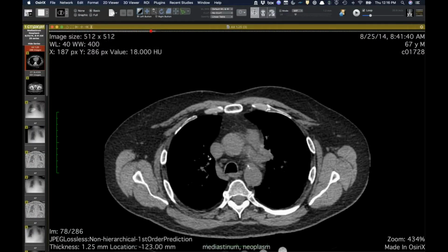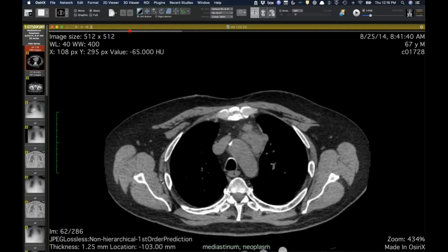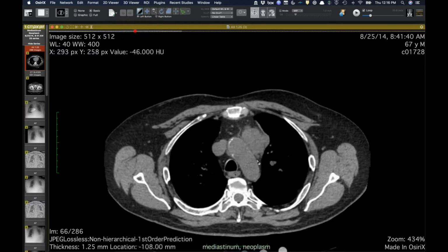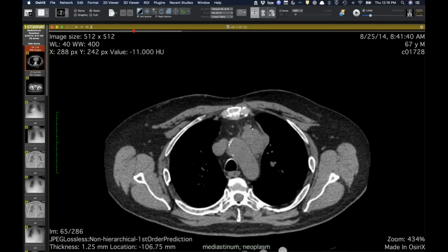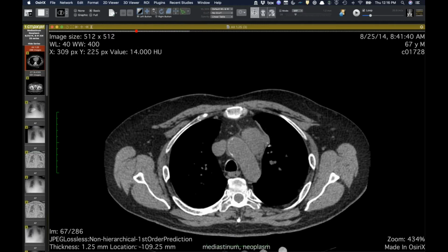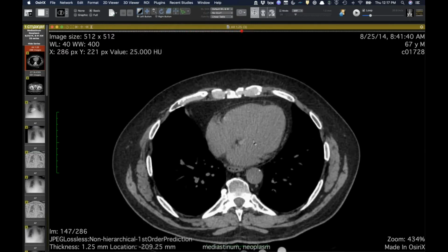And then this one is a long and involved case, but it's kind of an interesting one because it's along the anterior mediastinal mass differential. When we were talking about lymphoma earlier, this is a 67-year-old man who presented with this anterior mediastinal lesion, and you could see maybe a couple of discrete soft tissue nodules or lymph nodes here.